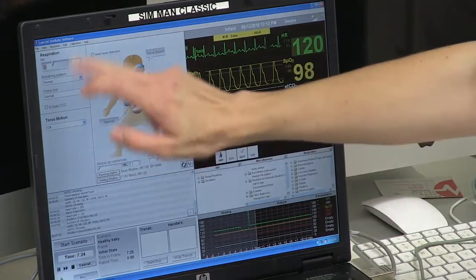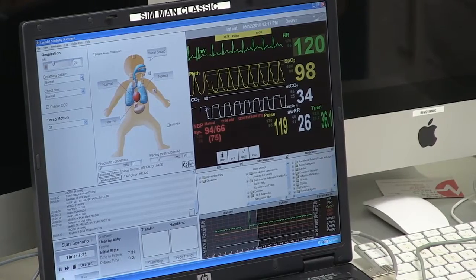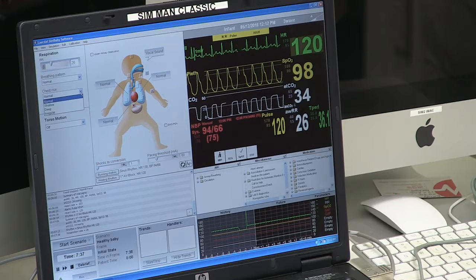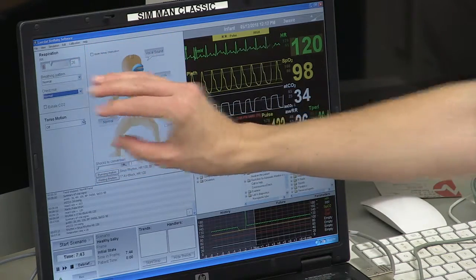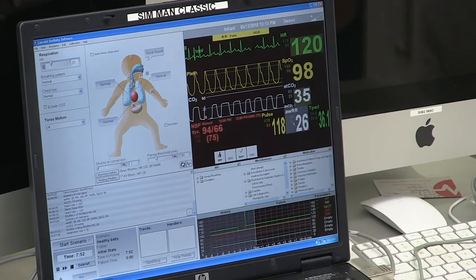A lot of the respiration information is on the left-hand side, so you can toggle up the respirations here. You've got breathing pattern on the left, so you've got normal, retraction, and seesaw that you can choose from, and chest rise: normal, shallow, deep, irregular. And also you can turn the torso motion on or off. I tend not to use the respirations on this side as much because I'm usually over here, so I just toggle back and forth with what I need to, including the respirations on this side.